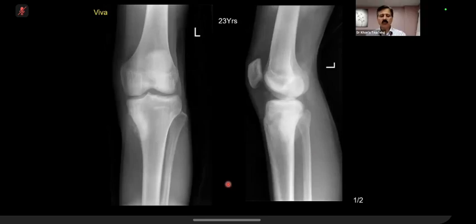Yeah, so this is critical here in this particular case. There is a black and white, what we call bony matrix, which is osseous matrix. And here the examiner is going to check your thinking. You can see the osseous matrix has also gone into the soft tissue. You can see all of this sclerosis. So because of that, you have to be more confident and emphatic that this is in keeping with an osteosarcoma.